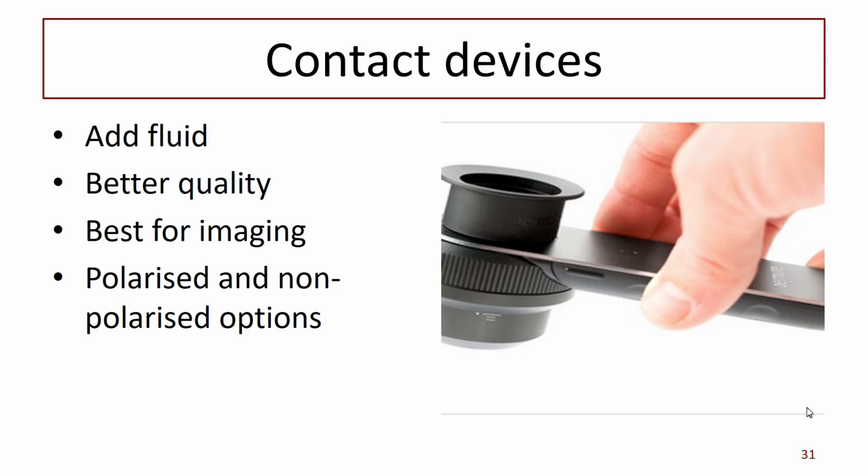So what you have to do in using a contact dermatoscope is every single lesion you must polish. Oh, there's a polishing cloth there, but I haven't put it out. It's actually in my bag. The bag with all the dermatoscopes in it has a plastic bag in it with polishing cloths and various selections of alcohol and so on. So you could use, for example, the gel that you have for cleaning your hands. So you would polish the lens, and then you use a polishing cloth immediately because you don't want the alcohol drying on the lens and leaving smudges.